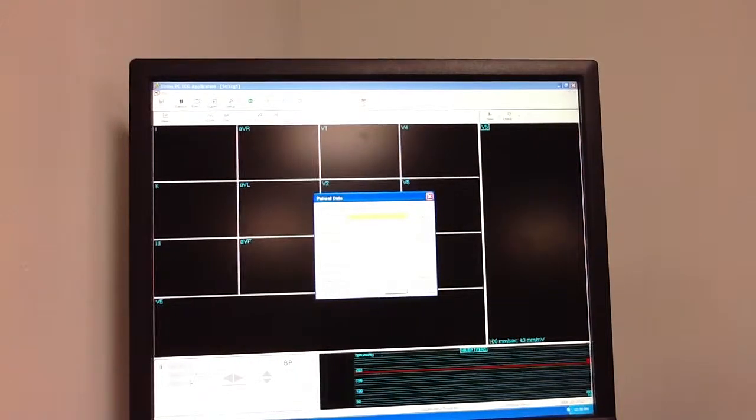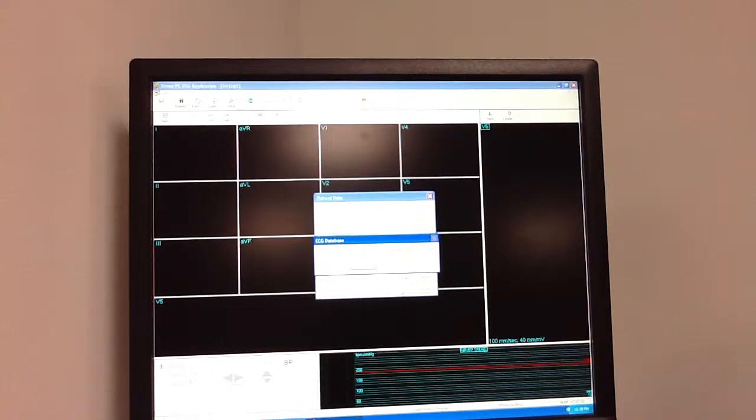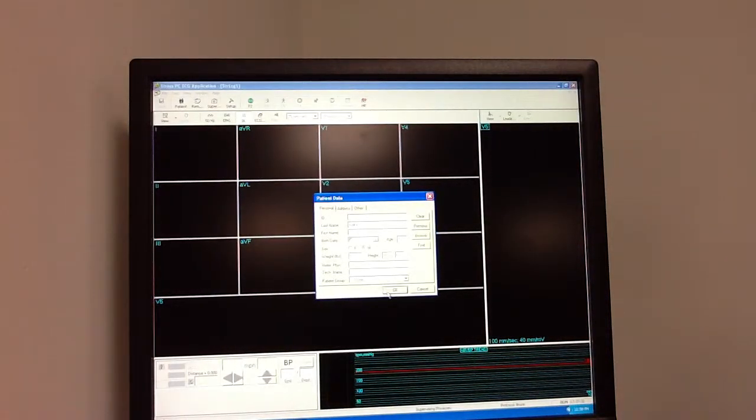So for the sake of this tutorial, I'm going to just enter my name and press OK. And another box is going to come up and just say that there's a patient with the same name, and is that the patient that I want? And for the sake of this, we're just going to say yes and then OK.